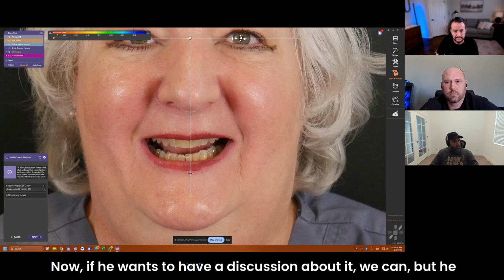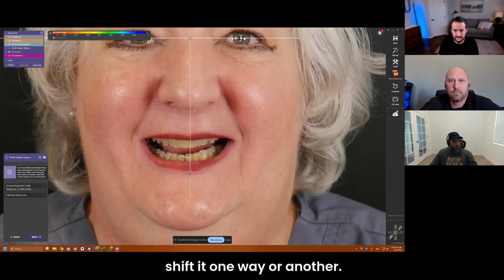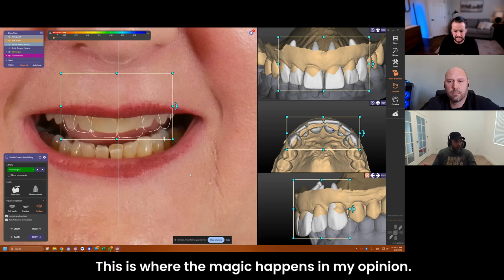Now, if he wants to have a discussion about it, we can, but he should be able to tell me, hey, I like where the midline is shifted one way or another. And then that should be about it. So after that, this is what we do. This is where the magic happens, in my opinion.